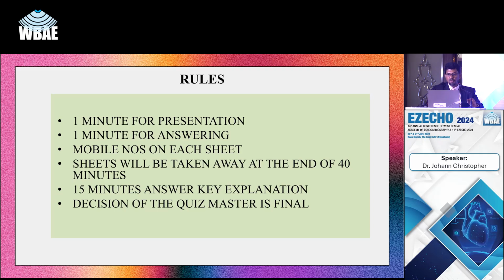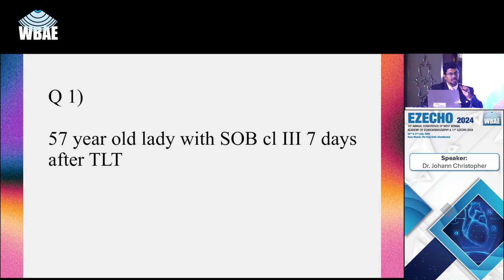So we are moving now, and these are your questions. A, is it an LAD partial thickness scar, or is it LAD no viability, or is it LAD ischemia, or is it LAD ischemia and viable myocardium? Remember the red arrow. That's the clue. So you have a minute now. Cine image on the left, and on the right you saw the delayed image, and you saw the red arrow. These are your choices.